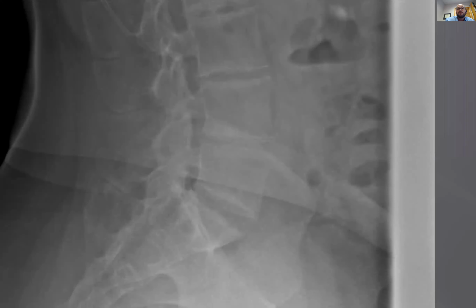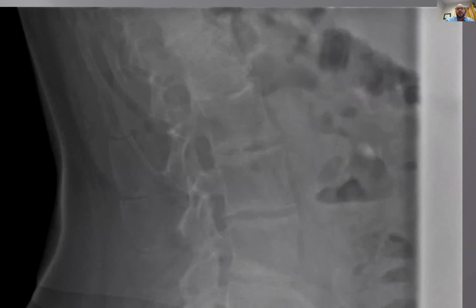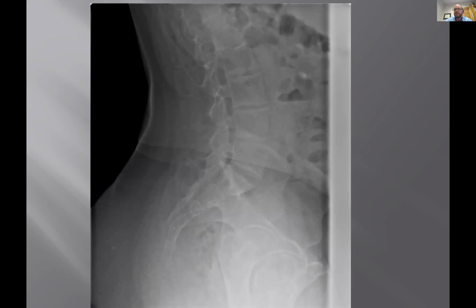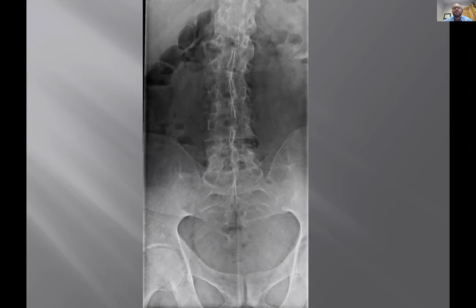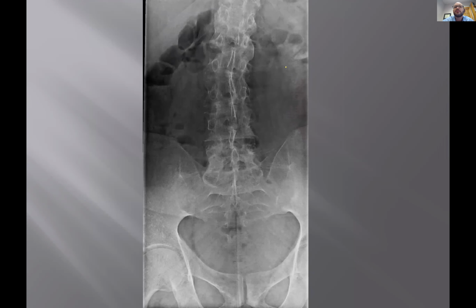If I make the, where are the joints? There's no joints there either. And really no other findings, arguably, on this. Now, incidentally noted, let's go back. There are also here, hard to see, but up right in here you can see some calcification in the abdomen, and you go back and it's just right on the edge of collimation.